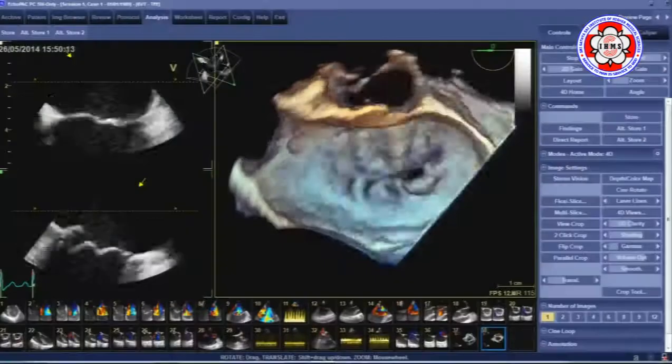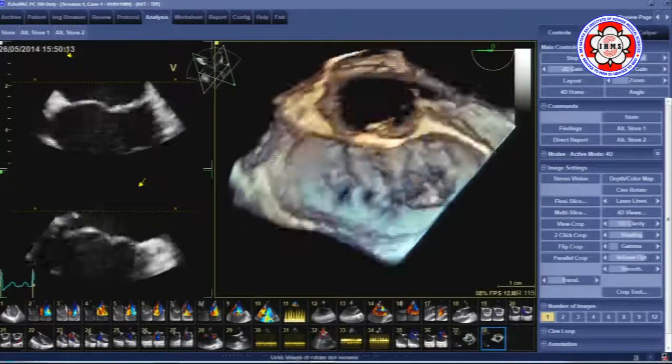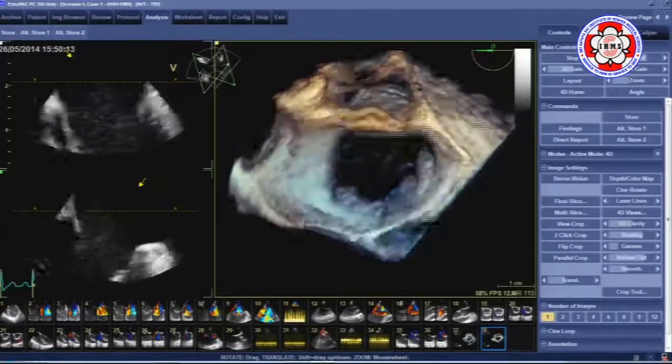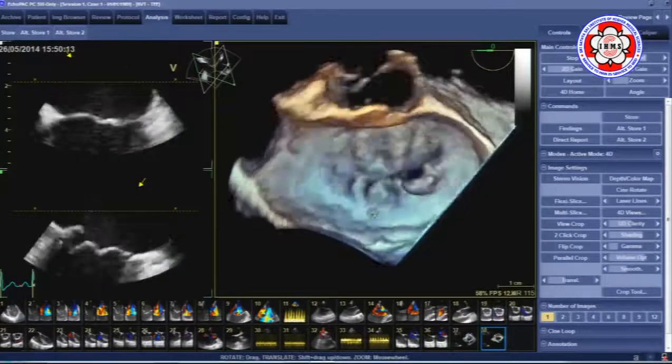what's being shown here. This is the images you just now saw, and so it's much easier here. This is A1, A2, A3. This is your aortic valve. This is your left and right fibrous trigones. Your left atrial appendage sits here, and then this is P1, P2, and P3.